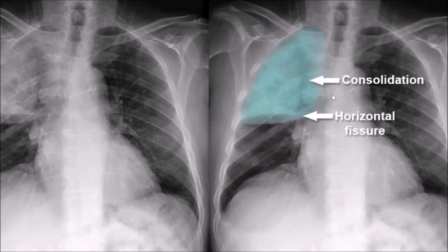So this is an appearance. There is a consolidation, okay? Tracheal deviation is a matter of further explanation. The trachea could be deviated naturally to the right a little. And you can go through our X-ray discussion on technical adequacy of the chest X-ray. They can explain it to you in detail.